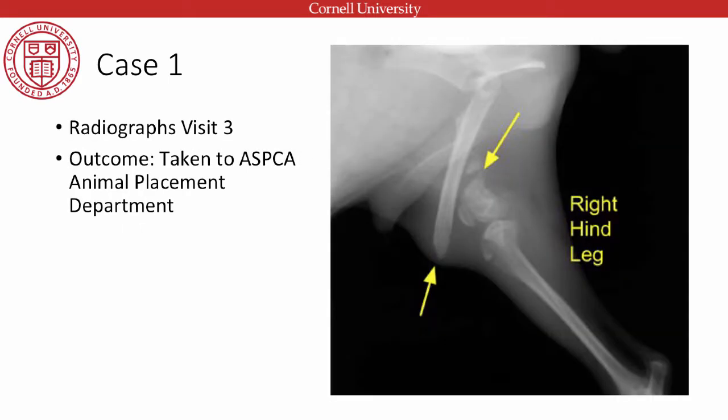So after his femoral head and neck excisions, which were done for the previous traumas, we now have a distal femur view. Notice this fragment is very, very close to skin edge. You can't really see that very well because it's not projecting very well, but it is. So it's about 2 millimeters from skin edge. So be a little bit careful. That degree of displacement may be predisposing to an open fracture. But he's got quite a dramatically displaced, probably mildly comminuted, I call this. I think this is a fragment of bone here. So we've got a comminuted distal femoral fracture, an extension through here.